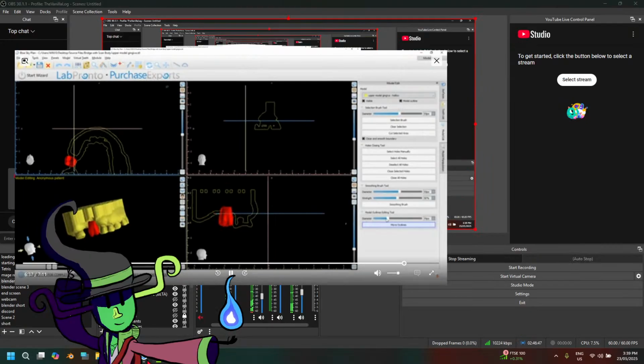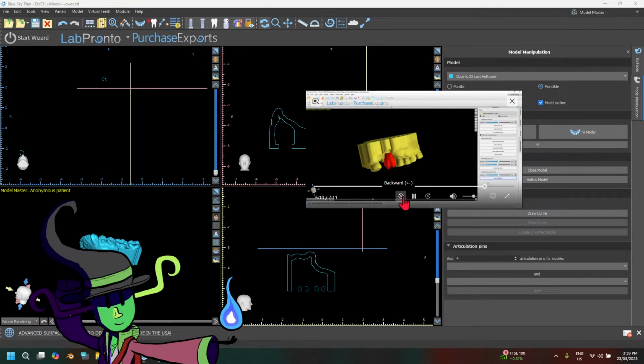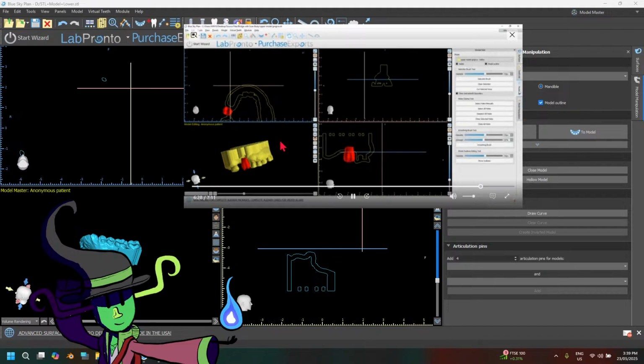Circles, we can change the size of the tool, and we simply grab. So how does this work? Our MPR views that we had our 2D slices as well. And what we're going to do is we're going to select the relevant model. In our model edit, select the model, and click move outlines. We hold down the shift key, our cursor turns into these circles, we can change the size of the tool, and we simply grab and drag, and watch in 3D as we do this.